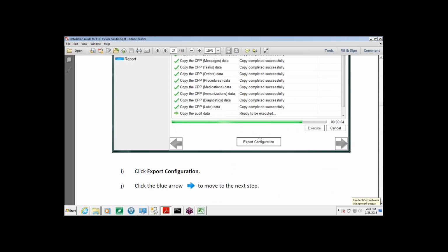At the same time, you can start scanning documents on the other side. And if you try to start the import tool too soon, it will let you know anyway. It will not let you do it.